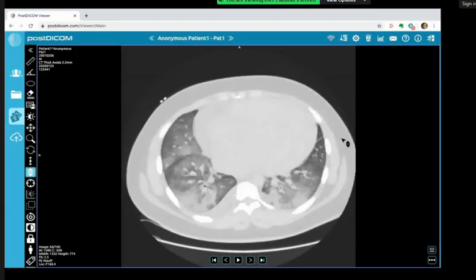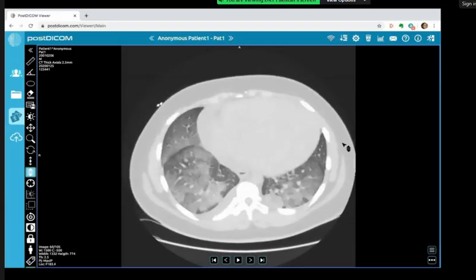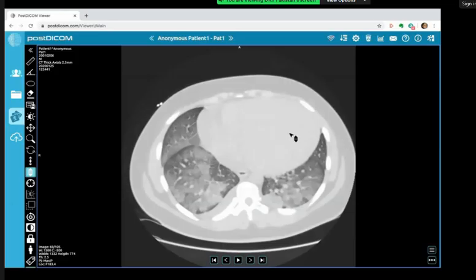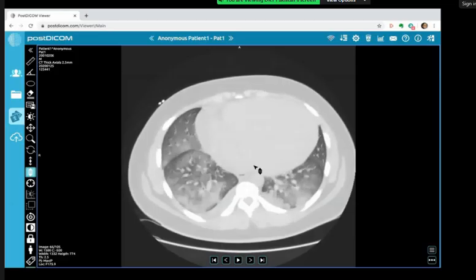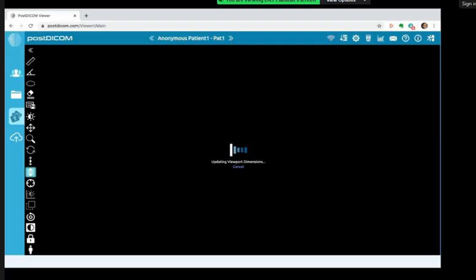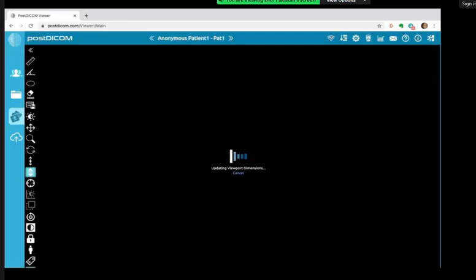Yeah. Okay, so there is, again, generalized cardiomegaly. There's a small right pleural effusion, significant ground glass coalescing changes in both bases, involving the bases and the right middle lobe. I think there's evidence of pulmonary plethora with enlargement of the hilar and enlarged arteries with some pruning very peripherally and some opacification in the apices as well.